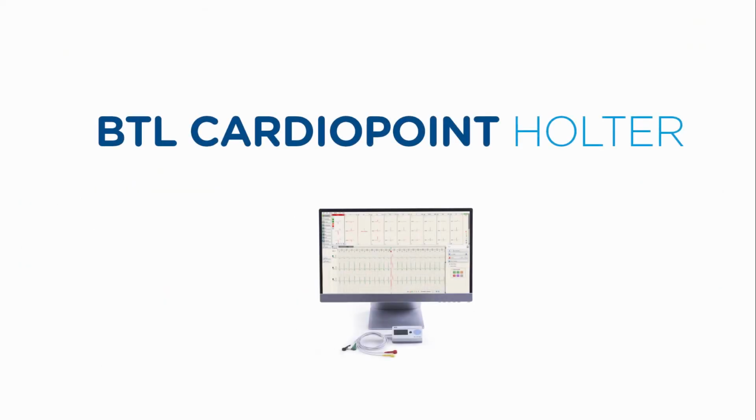In conclusion, the reviewed BTL CardioPoint Holter tools allow you to increase diagnostic confidence in Holter examinations while saving you time.